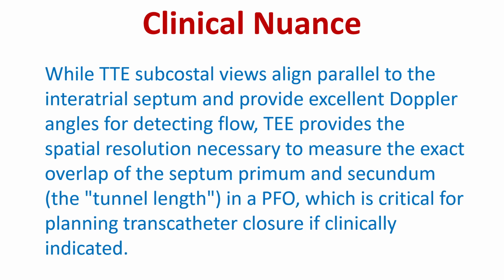While transthoracic subcostal views align parallel to the interatrial septum and provide excellent Doppler angles for detecting flow, transesophageal echo provides the spatial resolution necessary to measure the exact overlap of the septum primum and secundum, the tunnel length in a PFO, which is critical for planning transcatheter closure if clinically indicated.